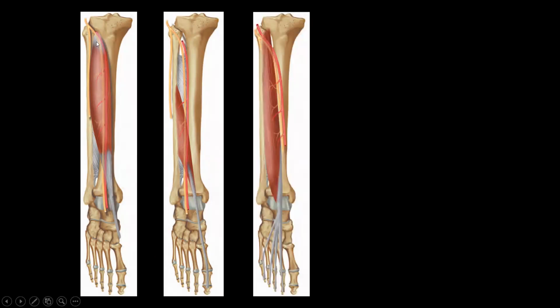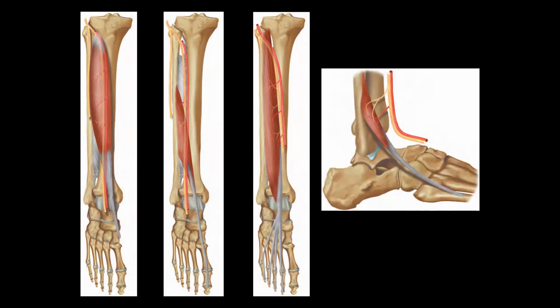This is tibialis anterior, which originates from the tibia and fibula and inserts over the medial aspect of medial cuneiform bone. And this is the extensor digitorum longus, which splits into 4 tendons and traverses across the different phalanges and attaches over the base of distal phalanges of the respective toes. Then we have peroneus tertius, which is a vestigial muscle, and it is not very important, and sometimes it is absent in normal persons also.